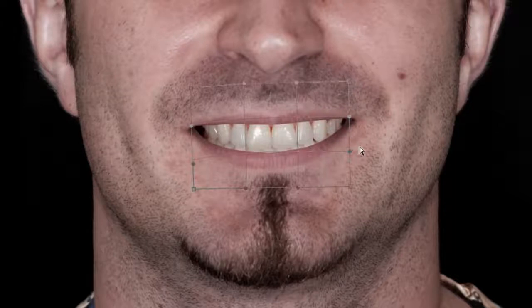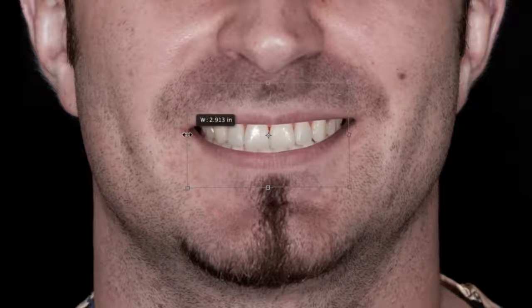Now I can toggle back and forth the Free Transform by Command T, and it goes back to the normal Free Transform, and maybe I just rotated it a little bit too much. So I'm rotating it back. Now if I want to distort this a little bit, I can. So now if I hold down the Shift or Option Alt to say I want to broaden the smile a little bit, I could have. That's going to change the proportion a little bit.